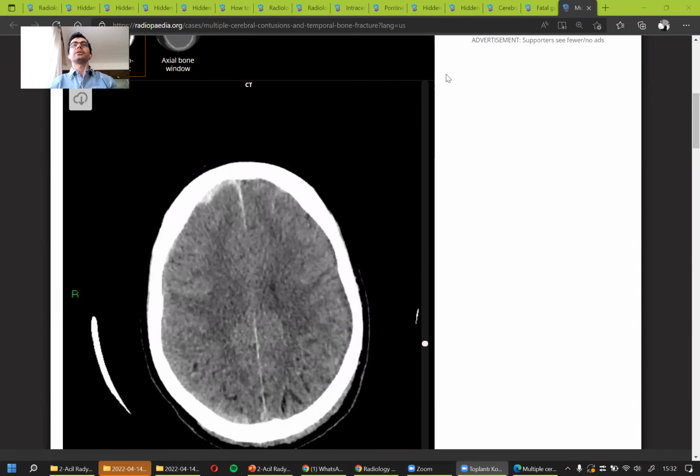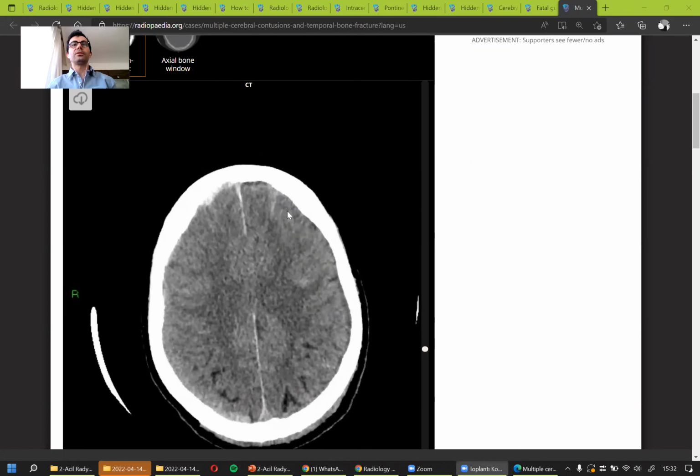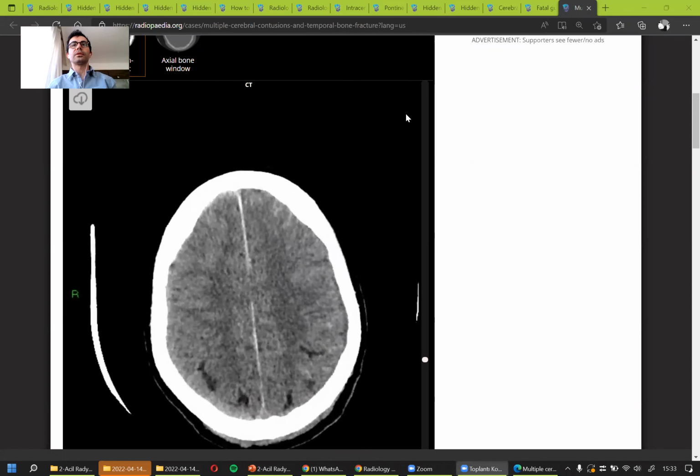People, because subarachnoid hemorrhages are in the subarachnoid space, they are basically where the cerebrospinal fluid is. So they paint the areas, they cover the areas where there is cerebrospinal fluid. If you look at this, there's a very small area of bleeding which goes right perpendicular to the bones. Can you see it? This is a typical case of subarachnoid hemorrhage, like these areas, these small lines.